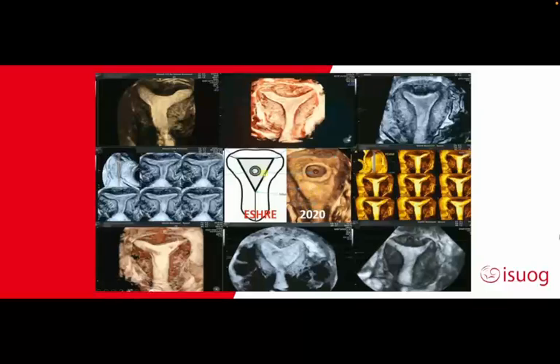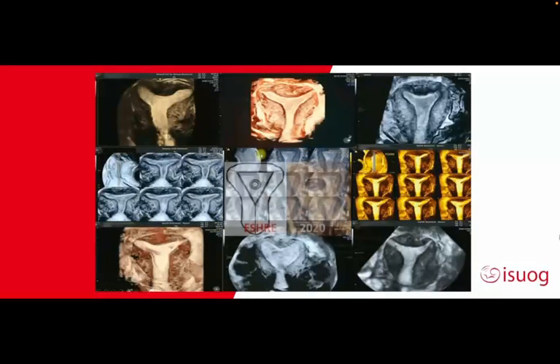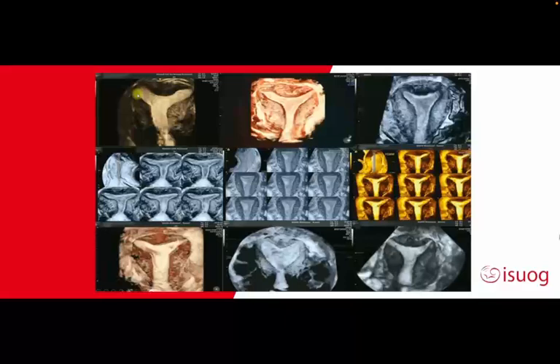However, we all know that in many instances the uterine cavity is not triangular, and if you have a pregnancy positioned up in this area towards the right tubal ostia, or in this case towards the left tubal ostia, all of these mimic the appearances of an interstitial ectopic pregnancy. You have to work out whether in fact it's lateral eutopic or whether it's partial interstitial ectopic pregnancy.